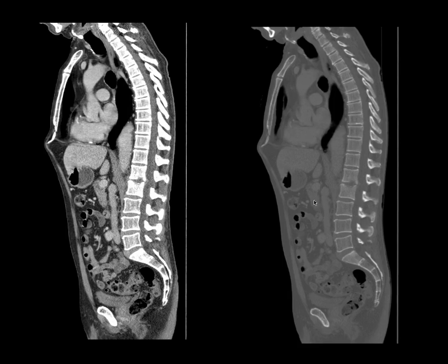Now, you can see this on plain films. They say about 3 weeks after the patient develops symptoms, and MRI is probably our investigation of choice because it allows us to identify the presence of any extradural abscess or extradural inflammatory mass or extension into the spinal canal, which might help us determine if drainage was necessary.